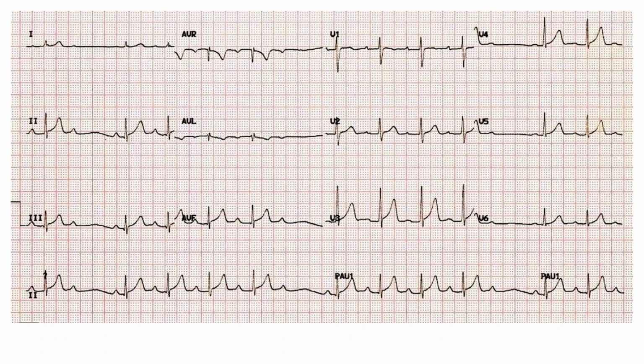Now we'll see one more example. Here, always look at the rhythm strip. You can see the PR interval here. You can see there is gradual progressive prolongation of the PR interval, and there is a non-conduction of impulse here. Also, you can appreciate there is group beating. One more point I told: whenever there is a non-conduction of impulse, always look at the preceding PR interval and the following PR interval. You can find that there is a significant discrepancy.